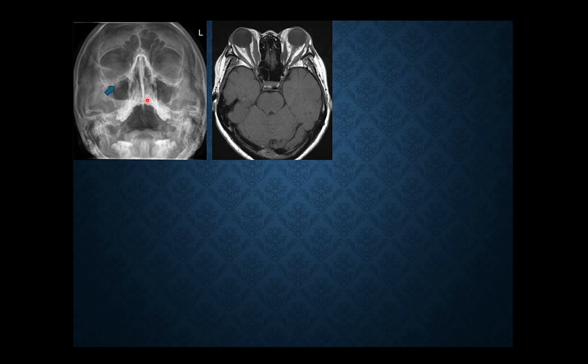It's at the right side. It looks like it could be a cranial hemorrhage. No, leave this bone and brain part. So this muscle is the medial rectus. This one, lateral rectus. This one, optic nerve. So this muscle is asymmetrically enlarged. This is the medial rectus, like a Coke bottle sign, right?